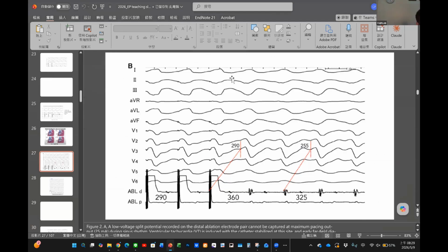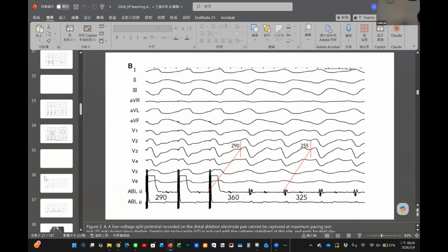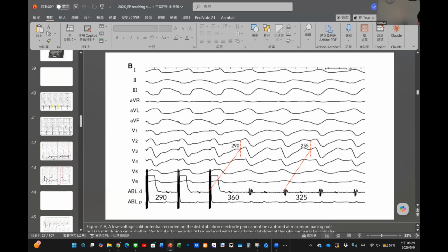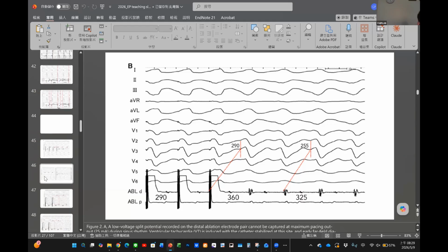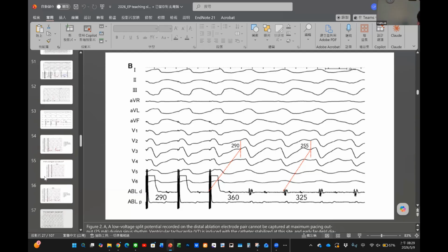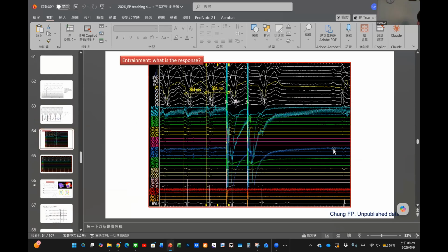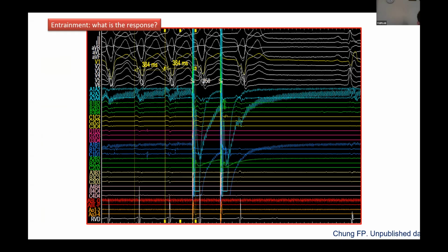Okay, finally, I would like to show one. Everyone could also review the YouTube talk by Ross about entrainment. It's a very good teaching course. So finally, I would like to show this one because this is very important, not only for VT but also for atrial tachycardia. So what happened to this tracing?